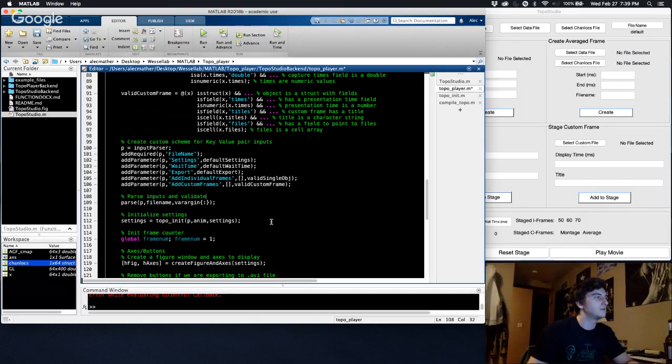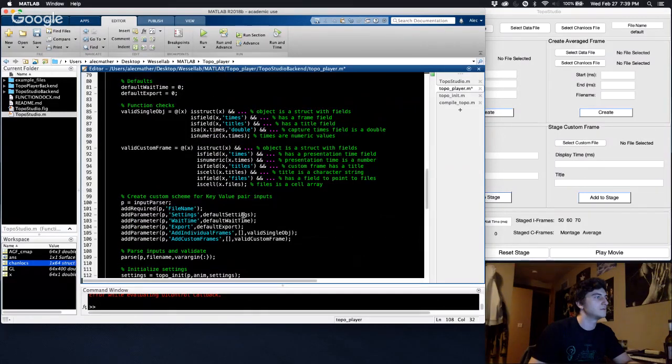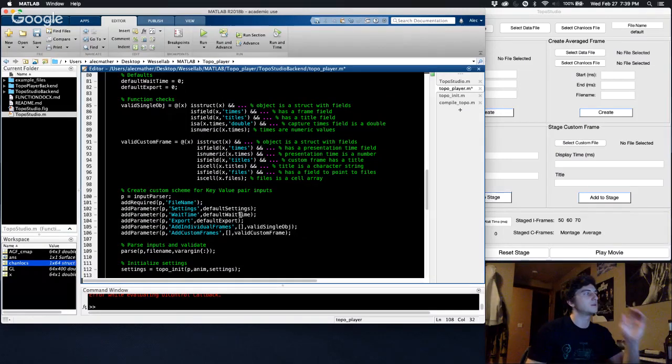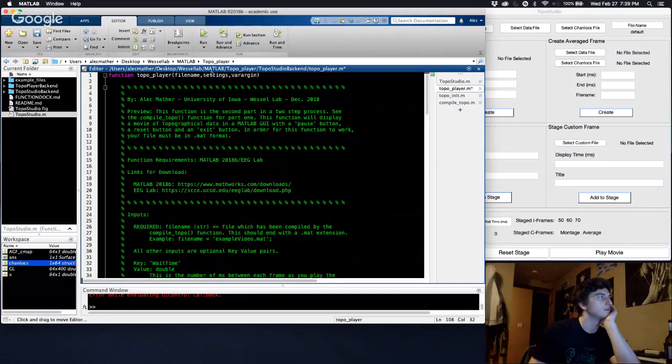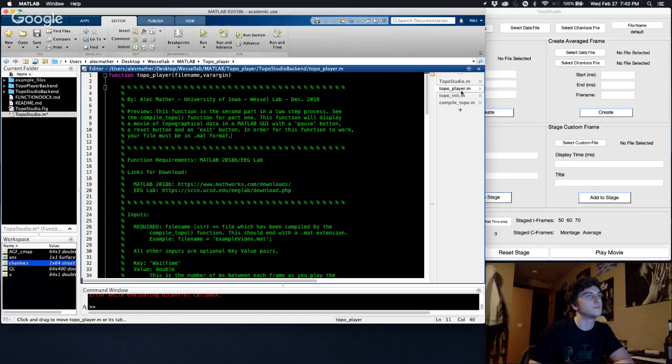So that'll be default settings. How's it gonna know what it is? Oh, it's up here. So that'll just be a parameter, so we won't need that. Settings. We'll do this. So we need to add our settings in as an optional parameter, but we're always going to be adding them in because we need to add a sample, right?